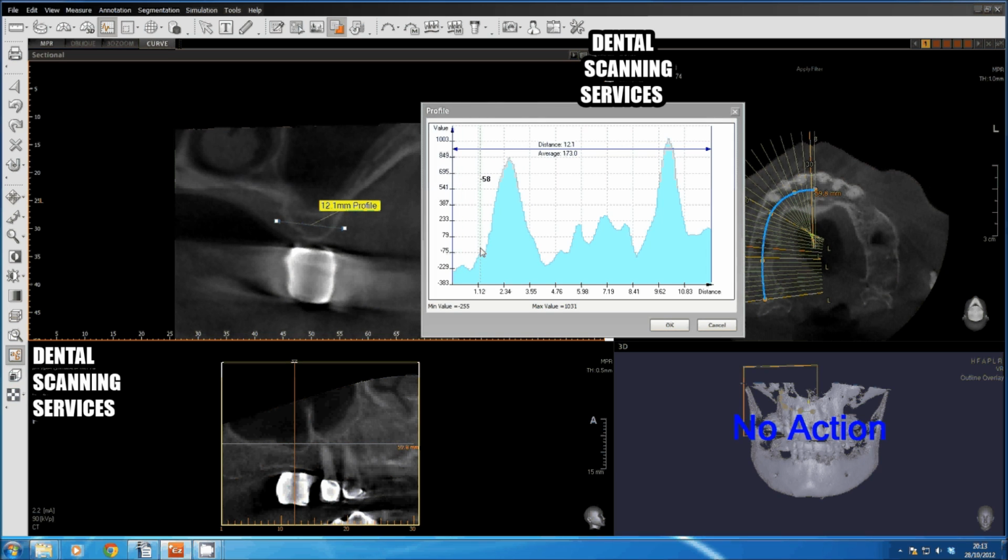Then you have the palatal tissue, because we're looking at the palatal first, giving you a density reading of 846. It comes down almost to the thickness of soft tissues in the mid portion, and then comes out to the buccal aspect, which is at circa 990.